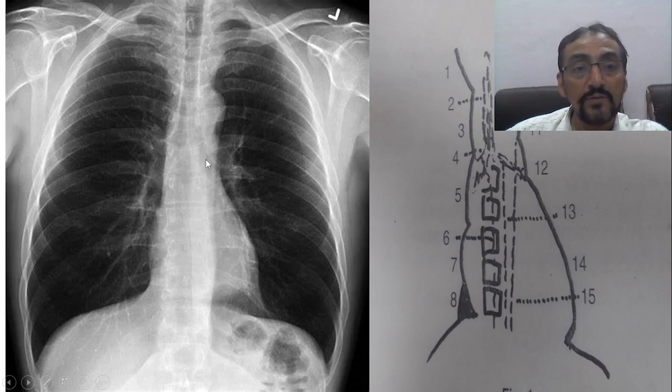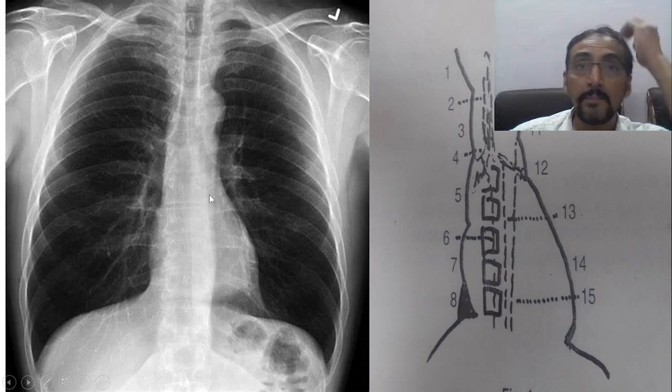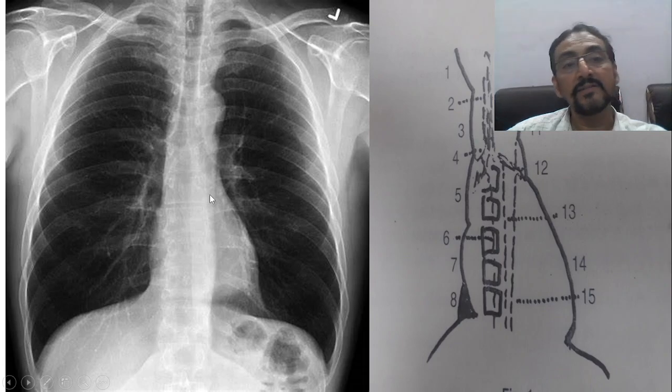Now once you see the vertebras, now see the side lines of the vertebra. Vertebra का जो side lines क्या है? See, ये एक साइड है, एक साइड है, और इसके साइड में जो लाइन है, this line is called as paraspinal lines. Okay, paraspinal और vertebral paraspinal lines. Okay, so यहाँ तक आ गए हम. So ये आ गया आपका appendage, ये जो डोम शेप है यहाँ पे, this is appendage. यहाँ पे आ गया paraspinal lines.